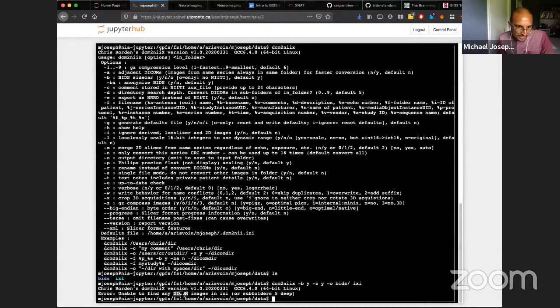Unable to find any DICOM images. I wonder if this is a permissions thing. Let me try using the source.